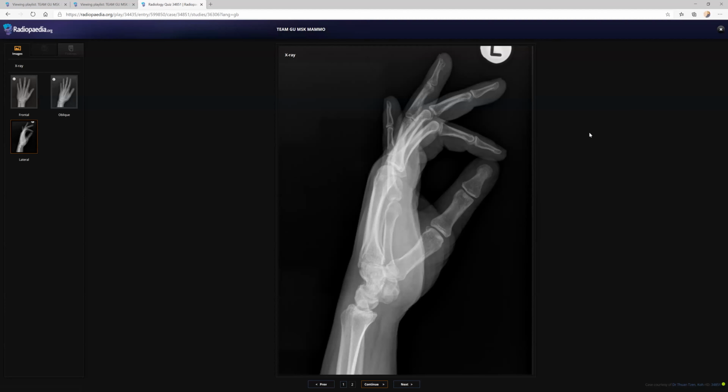In the lateral view, what I can see is that there is volar tilt of the lunate, and the scapholunate angle. That's fine. That's not a true lateral. You can look at the other bones here. I'm looking at the other bones. What I can see is that there is proximal displacement or movement of the fifth metacarpus. Leave the mouse, please. Okay, I'm leaving it.